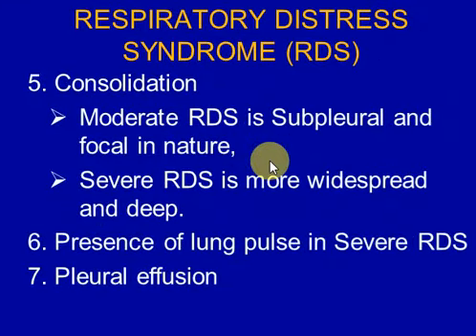consolidation. You should have consolidation. In mild to moderate RDS, it is subpleural and focal in nature. In severe RDS, it is more widespread and deep. We have lung pulse in severe RDS, and you may have pleural effusion.